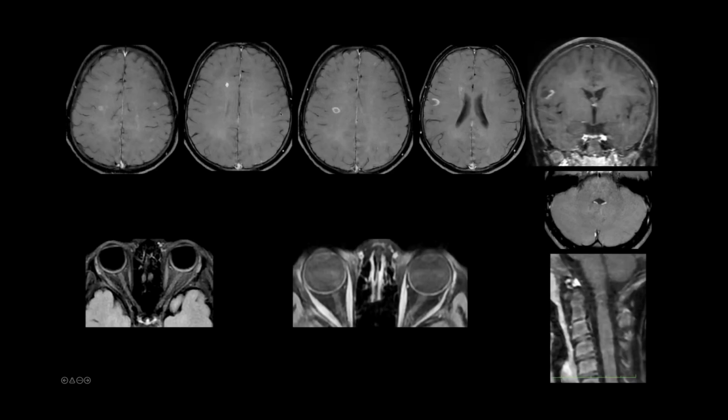Post-contrast study, we have a ring-like enhancement in the cerebral white matter lesions along the centrum semiovale and the superficial white matter. Some areas of incomplete ring enhancement are demonstrated along the juxtacortical lesions. No enhancement in the posterior fossa.